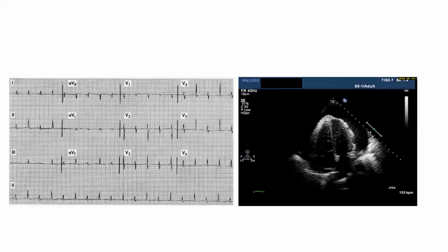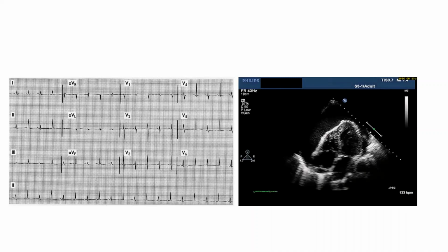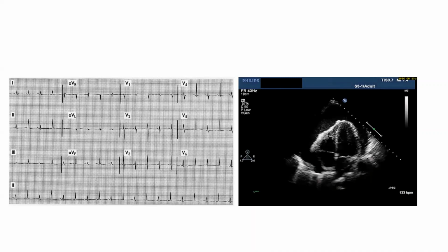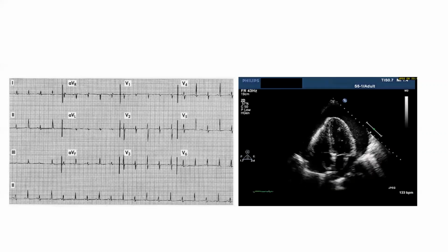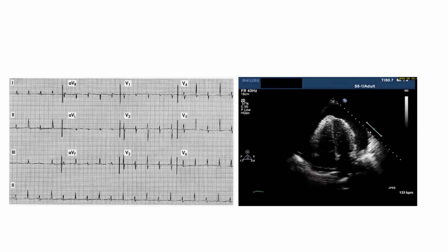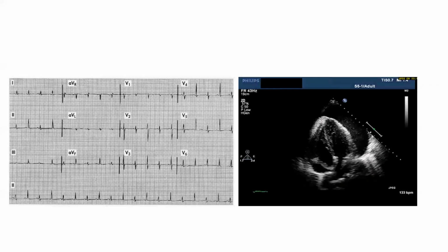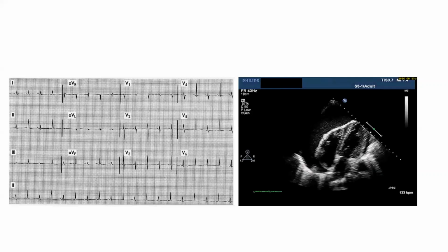This is a massive pericardial effusion with a swinging heart. Very good. Are they related? Yes. In what way? The heart comes near and then away from the chest wall. Exactly, giving the ECG feature called electrical alternans. That's great. Thank you so much.